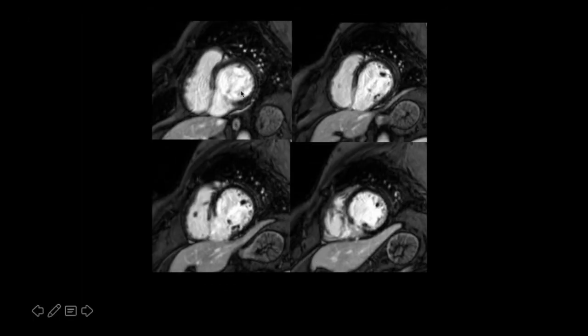And these are the LGE images, and basically I think you can't appreciate the wall because it is of the same enhancement as the blood pool. So this is all infarcted, chronic old infarcted septum with a post-infarction VSD. And the QP:QS here was actually quite high at, sorry, I did that. Okay, 3.8.